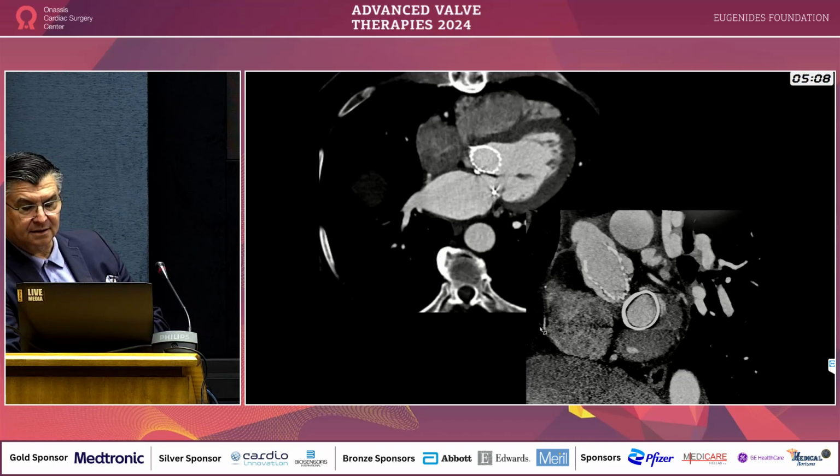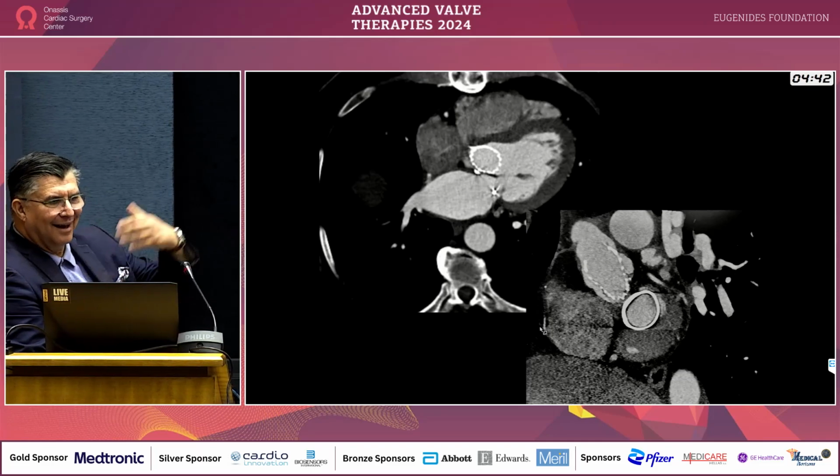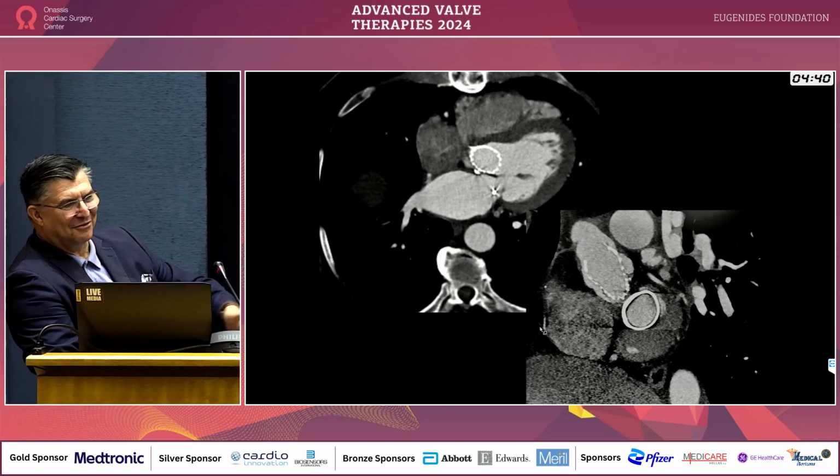This is a case that was done a couple of months ago at our institution. Personally, I read it as normal. And then Dr. Athanasopoulos came to my office and said, I remember a case I told you a couple of months ago. With Dr. Iakovou, we had just finished reviewing it, and then everything started falling in place.